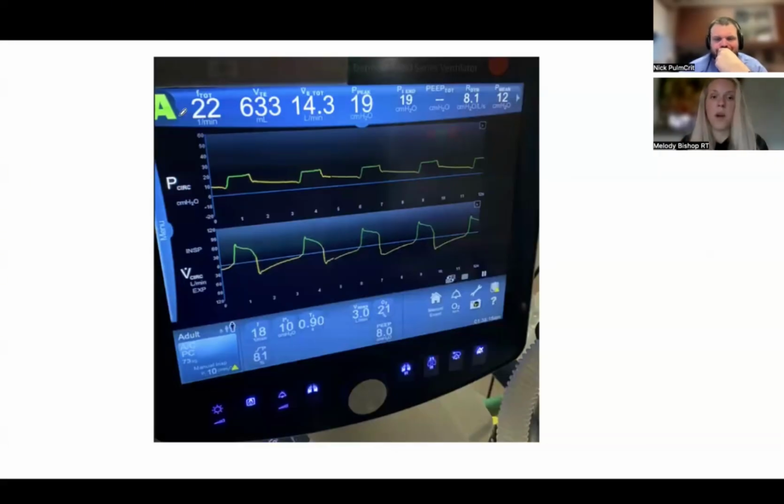When you look at this waveform, what are you looking at and what do you see? Yeah, what I see is, when we talk about the vent, at least with the students, it's exactly what you said, which is what's fixed and what's not fixed. So what's fixed is the pressure, and what's not fixed is the flow. So that tells me that the flow is free.